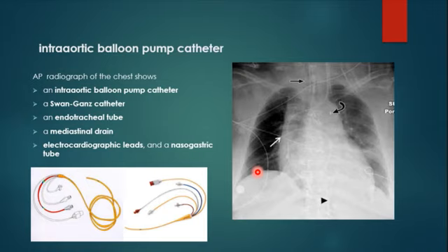It is easy, I hope, inshallah, easy. For the first time I thought this was maybe a central venous line, but the pathway, the curling from the right atrium into the right pulmonary arteries, it's not easy.